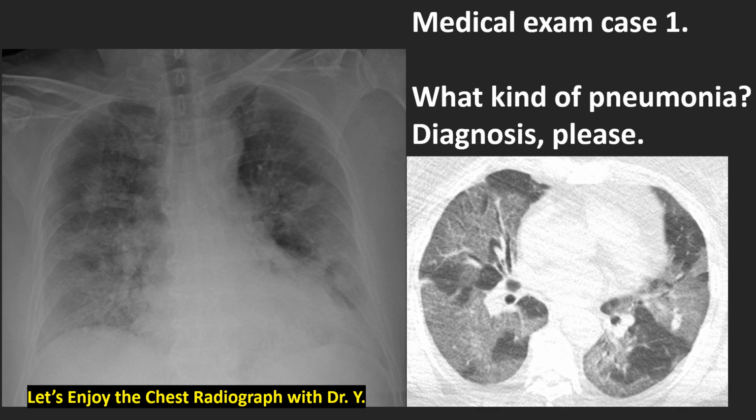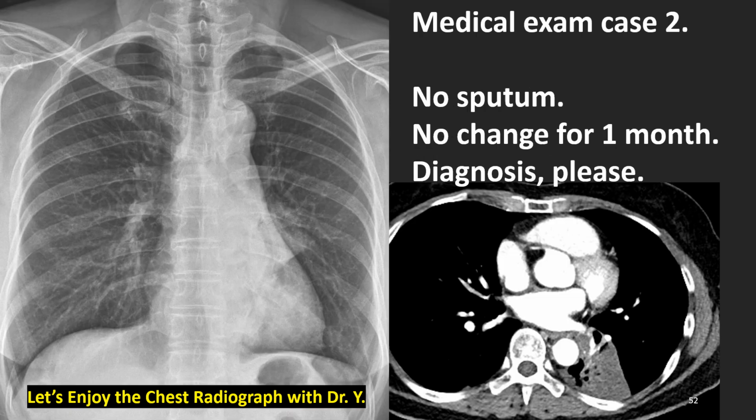What kind of pneumonia is this? Diagnosis, please. Medical exam case number 2. The patient has no sputum. The radiologic findings have not changed for 1 month. Diagnosis, please.